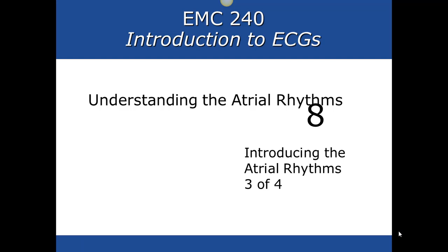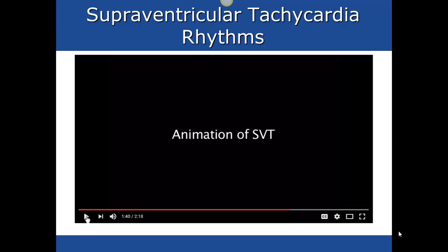This is part 3 of 4 in understanding the atrial rhythms. So let's look at a short animation of SVT, and we'll talk more about that in just a moment.